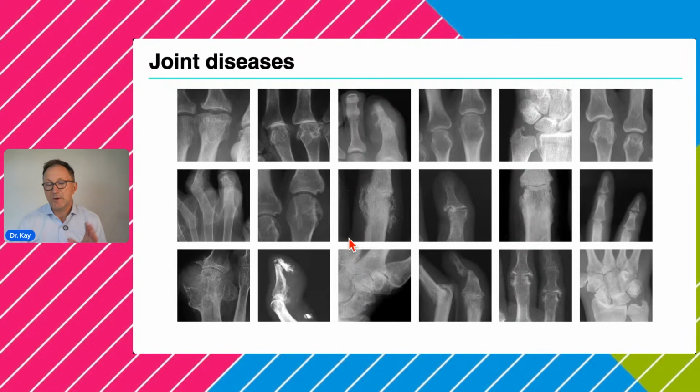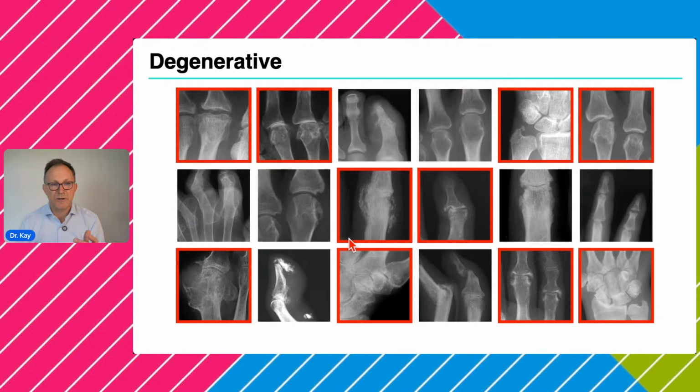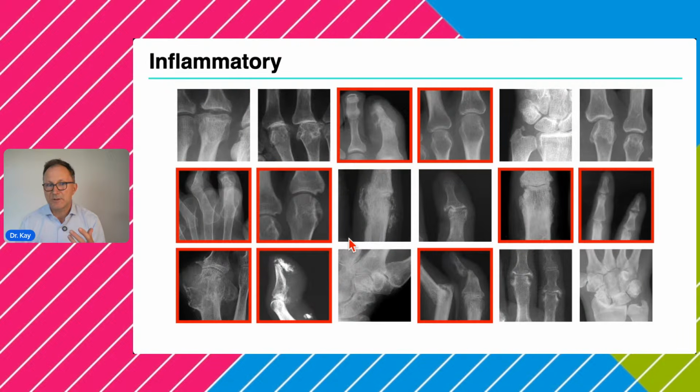So today we will speak about X-rays of the hand and feet, but of course, if you perform ultrasound, CT or MRI, you will see many more changes and diseases very early, and sometimes it's very difficult to come to a good differential diagnosis. So the trick is at the beginning to not start with the diagnosis of the single joint or the single patient, but to get an idea if it is an inflammatory change or a degenerative change.